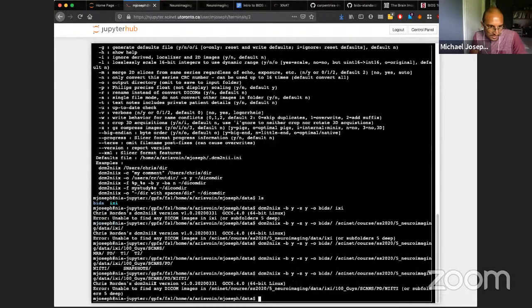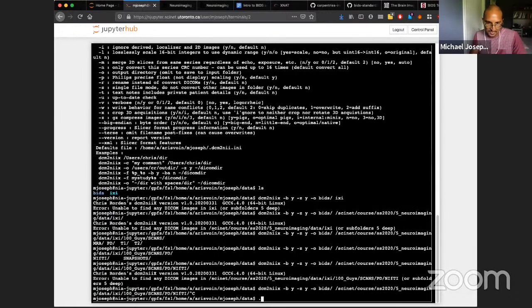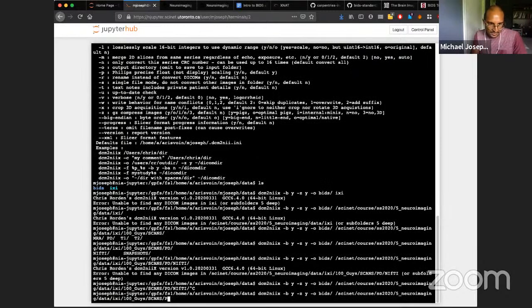Oops, it looks like this dataset is all NIfTIs. So we have to use another one. One second. So there was another dataset. I think it was called BIDS tutorial data. Yeah.